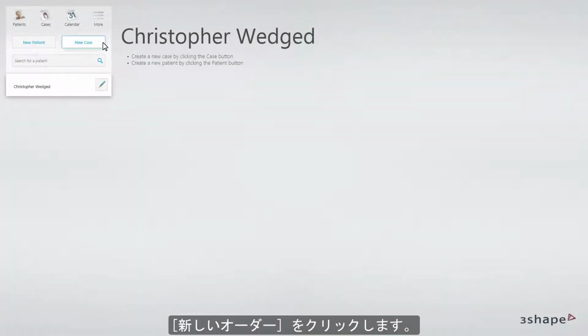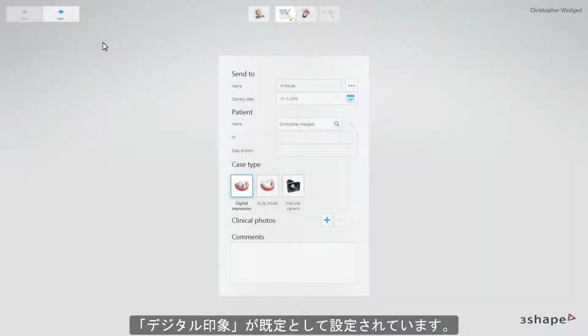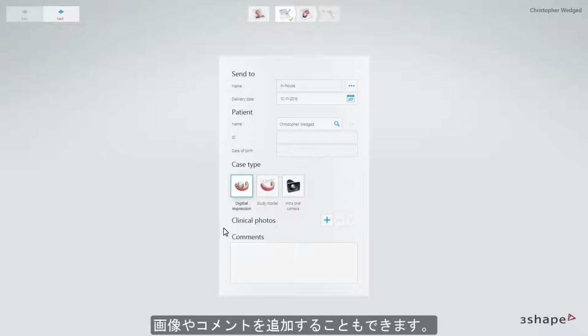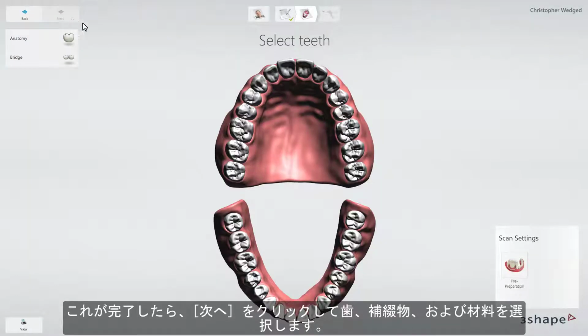Click on New Case. Digital impression is set as default. Fill in the rest of the order details if necessary. Adding photos and comments is also possible. When ready, click Next to select Teeth, Restoration, and Material.